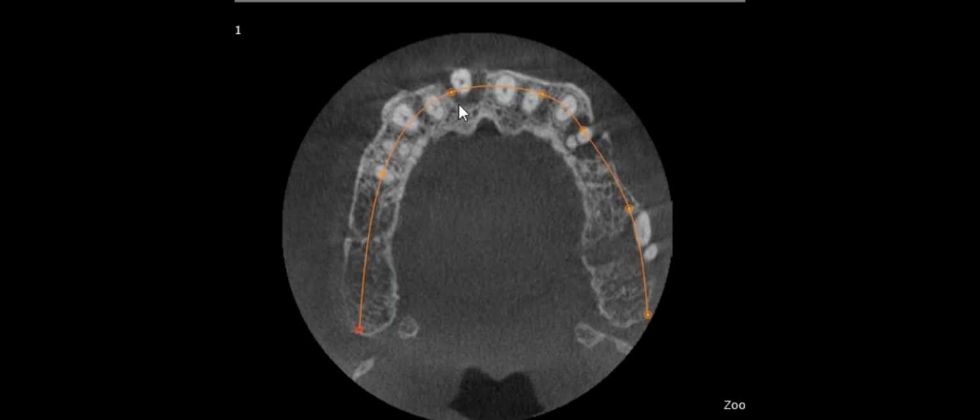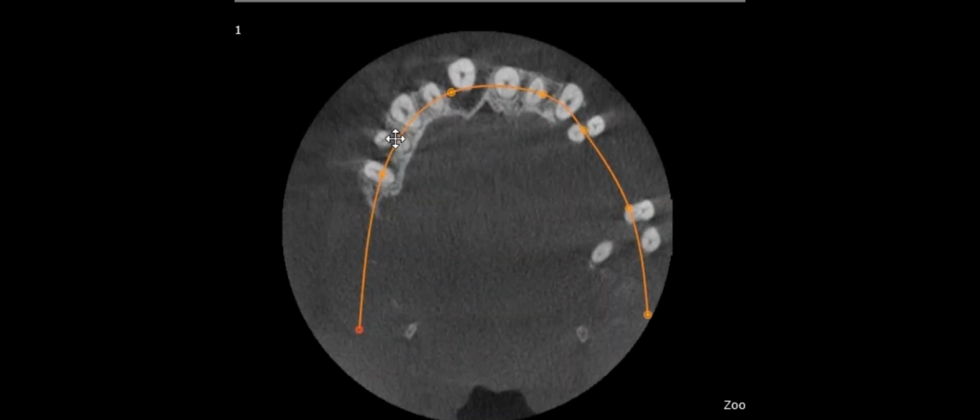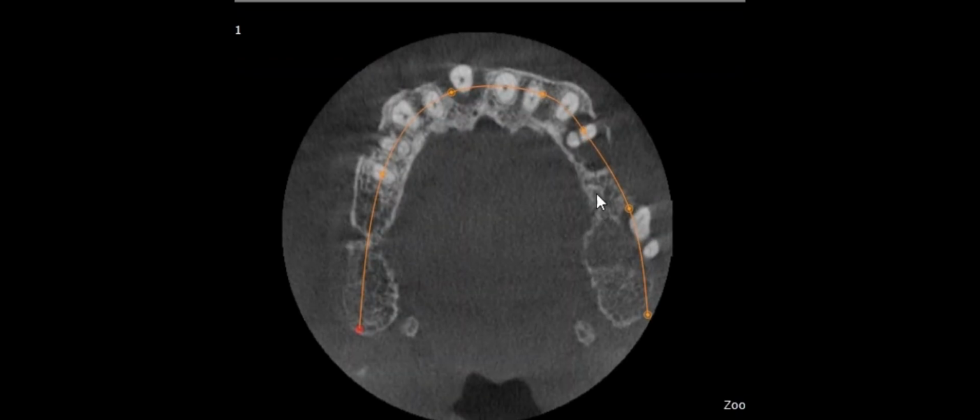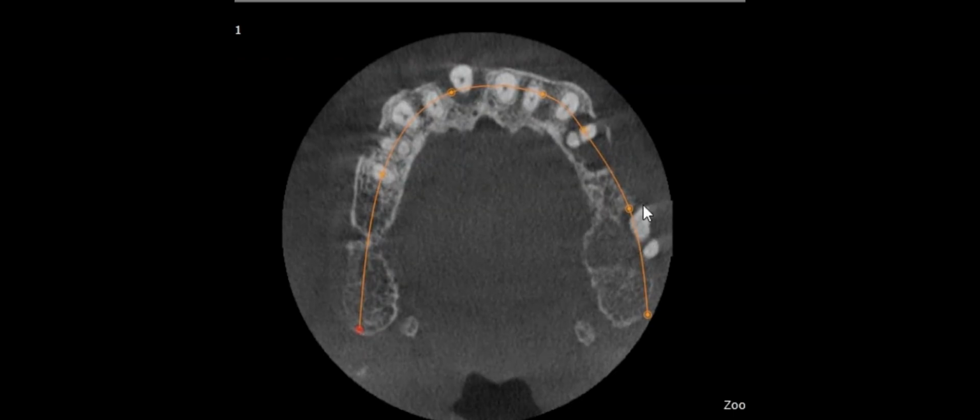And in the third plane, we can see how much bone is lost around the front tooth root here. And if we scroll, we can see similar bone damage and loss around the premolars on his upper right, and similar bone loss around here. You can see this big dark area of infection and bone that has been damaged and destroyed, and a similar concept around the molar on his upper left.